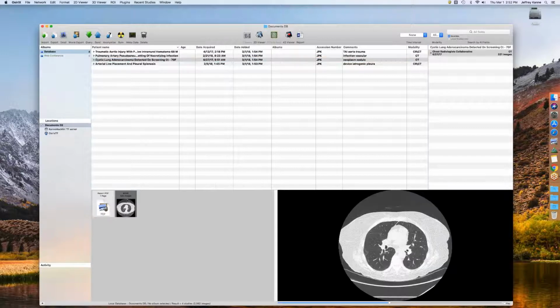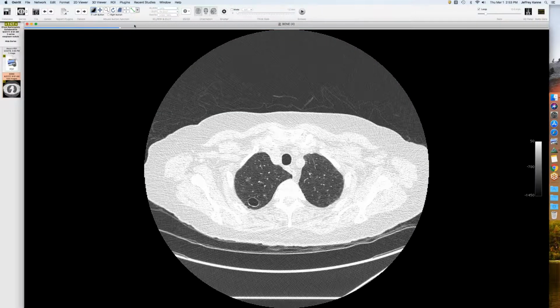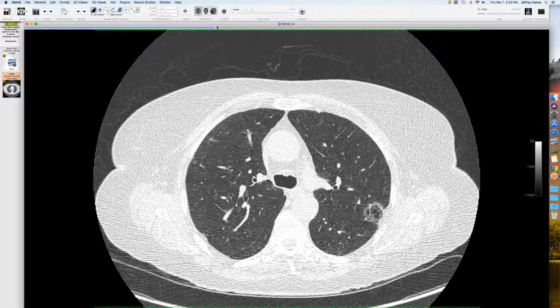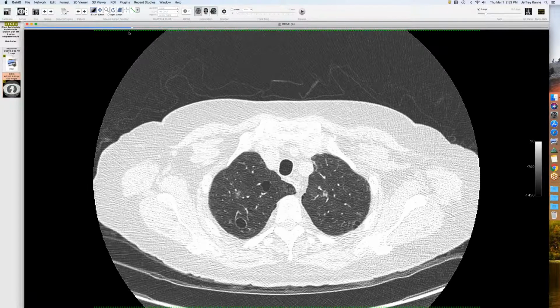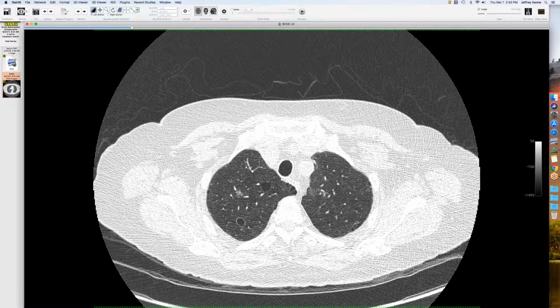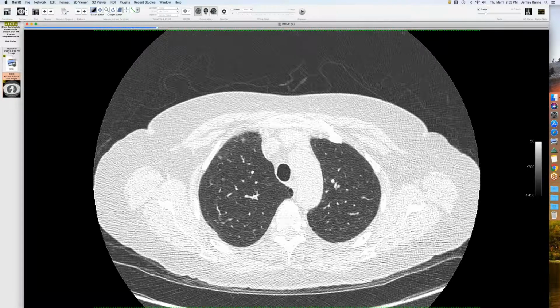All right, I mentioned this last week, and this is just a good case when you're talking about Lung-RADS. This was a lung cancer screen baseline, and there's some weird cystic stuff in the apices. I think that's just funny emphysema. I don't know what to do with these nodules. I don't know if it's smoking related, a little LCH in there or something.